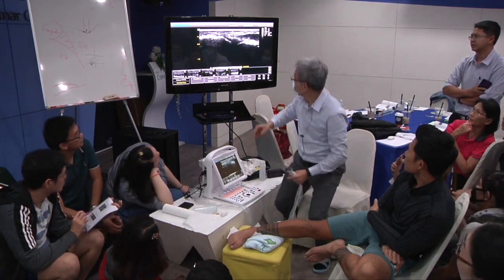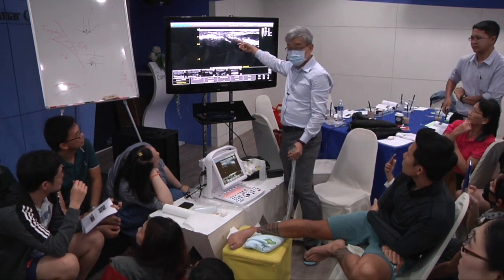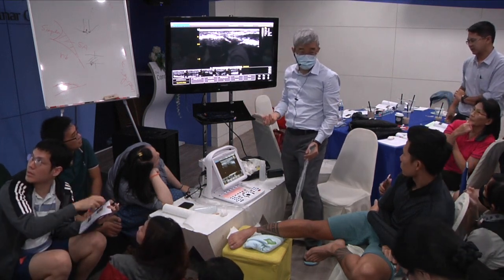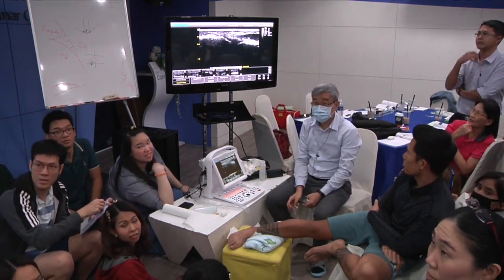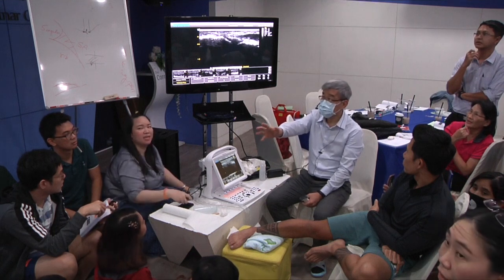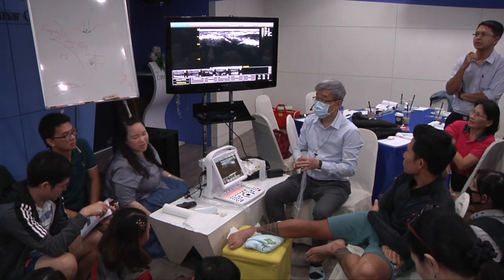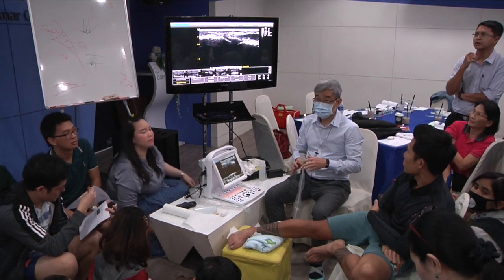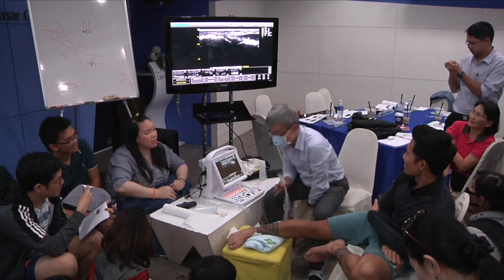Good. Fibers, right? It's easy. Okay. Yeah. No, anterior. Yeah. It's posterior. What's wrong with the foot?